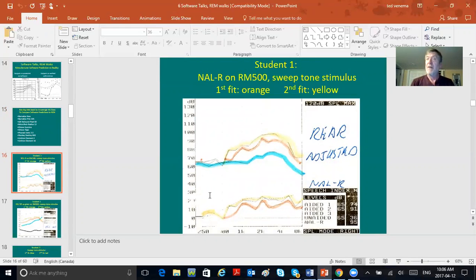On the software, she entered the hearing loss into NAL, chose the manufacturer, picked the fitting method, and then hit enter. And the manufacturer's software, okay, there's the target. And the hearing aid is now programmed to meet our targets. Looks good on the screen. The hearing aid gain looked just like the target gain for NAL-R. Now remember, we're talking gain here. It's the old fitting method, NAL-R. Remember, they didn't use output then. So let's look at this. Here's the target, the light line, right here, that dotted line.